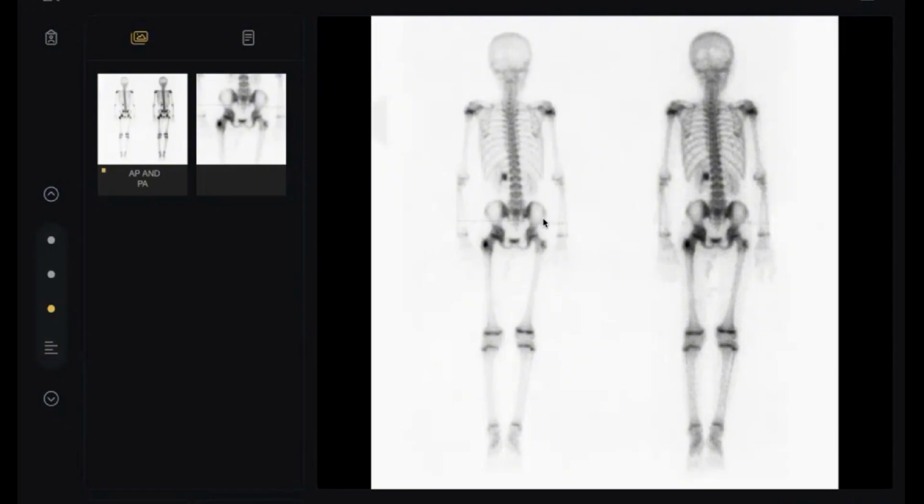Do I notice something else? This is anterior, this is posterior. You must ask for something. Yes, I want to ask for other views, because I think both are posterior. Maybe I can benefit from the anterior projection. Both are posterior. Yes, you must ask for anterior.